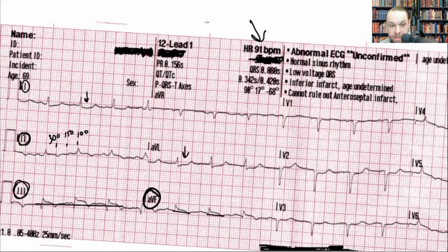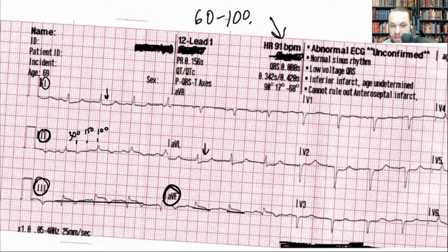Right. So heart rate is 91. So a little bit below 100. Usually, I said that if you have a proximal, higher up RCA involvement, it's going to occlude the SA node. So do we have occlusion of the SA node here? Probably not, right? Because my heart rate is in the SA nodal range, 60 to 100. So this is probably more distal, right?